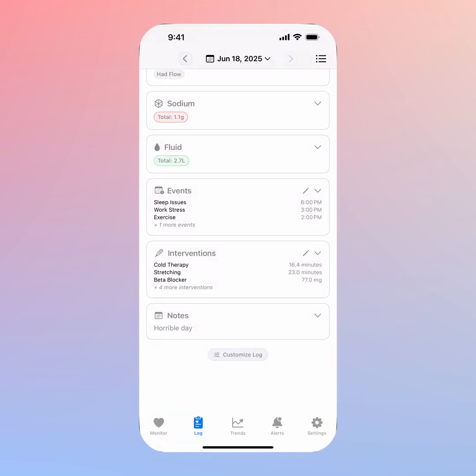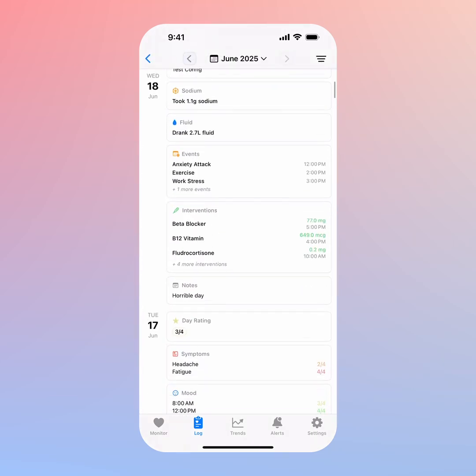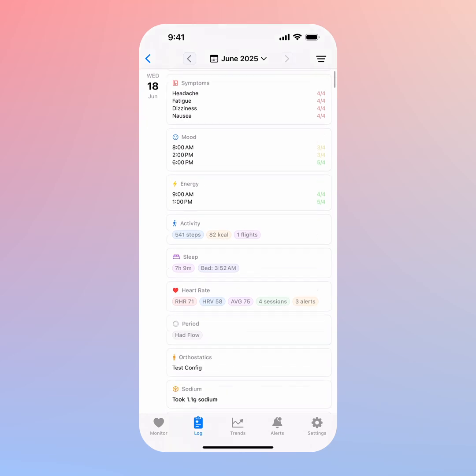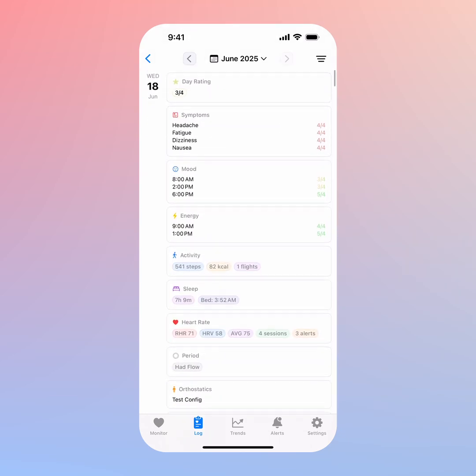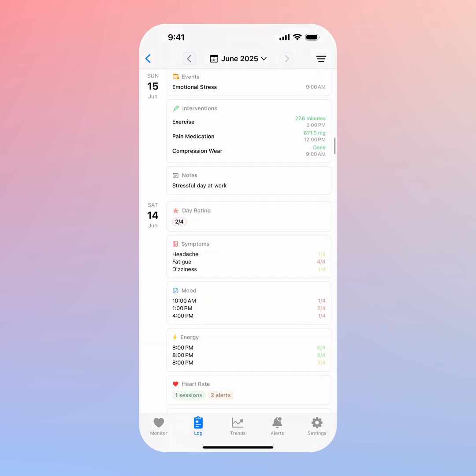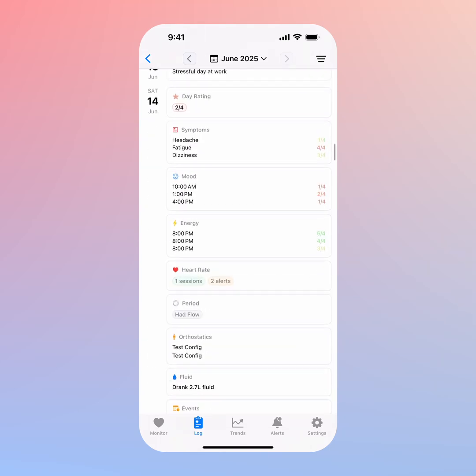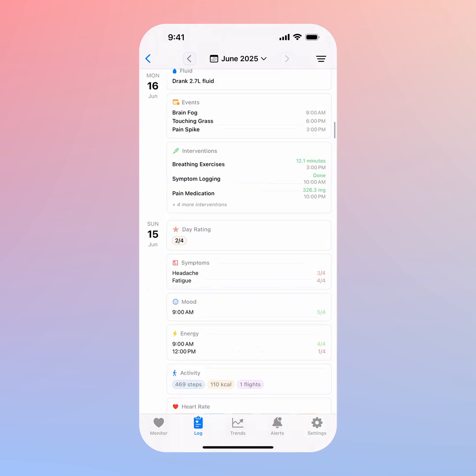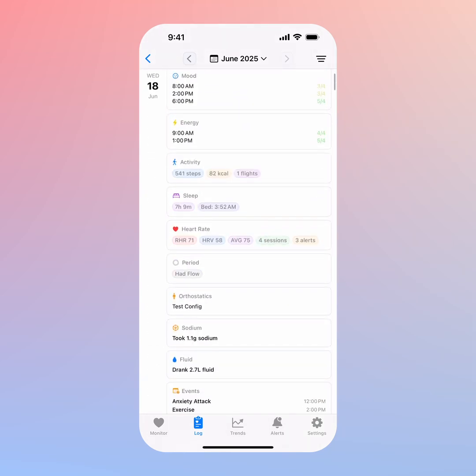So yeah. Next we have a timeline view. It's a very clean sort of timeline log. It's month by month, and it allows users to quickly see how things are trending, and because it gives you a very high level overview or snapshot of things that you're trying and all the different details about everything. And this isn't doing any analytics yet. It's more just about showing your data in a very efficient way, in a way that's easy to scan and reflect on.